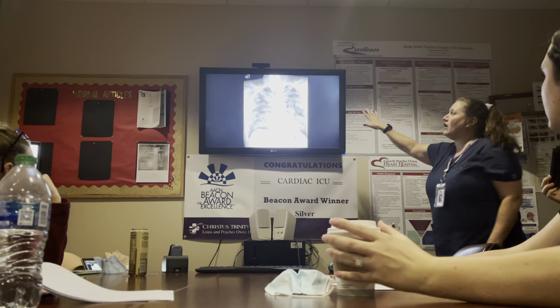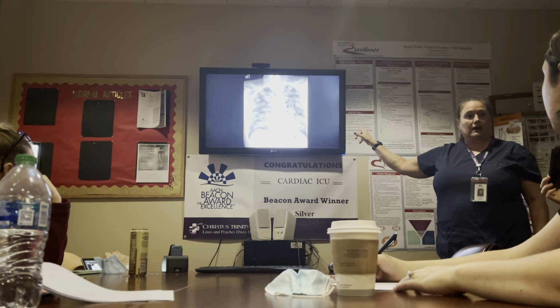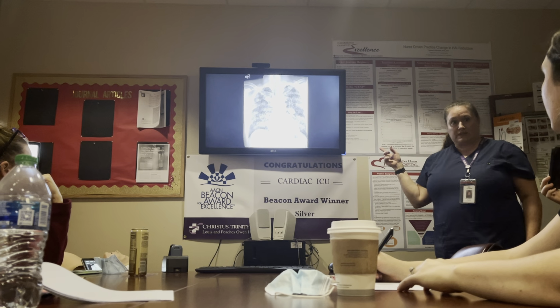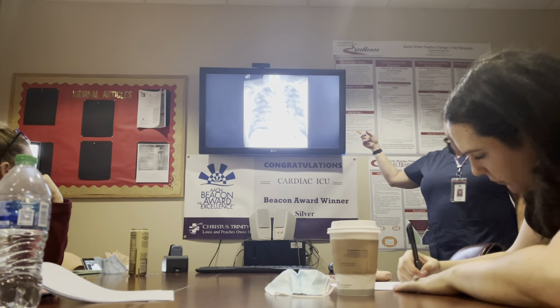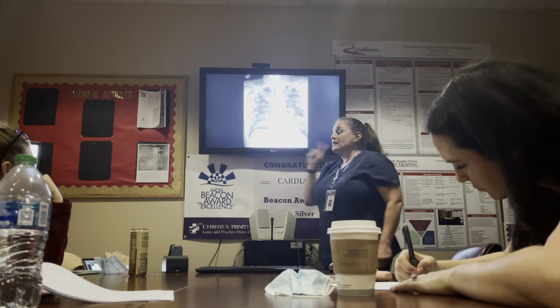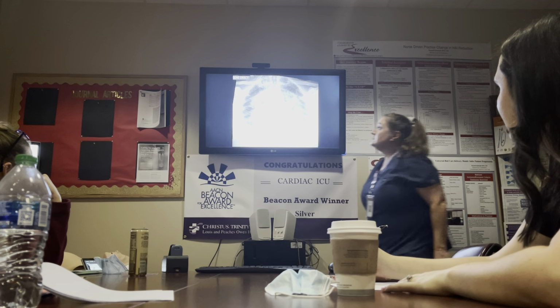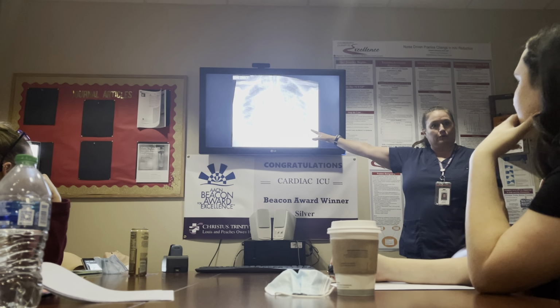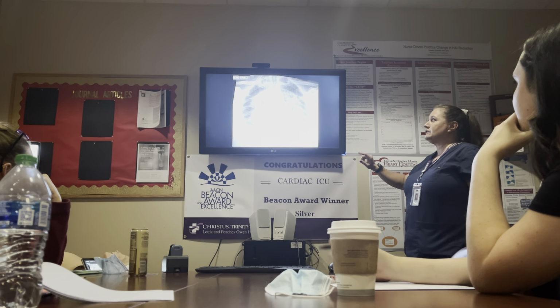Both sides are involved. This is a picture of ARDS, okay? This is what a typical COVID patient nowadays could very easily look like. Okay, compare and contrast this to this next film, okay? Very similar as far as the haziness goes. But what do you see differently?